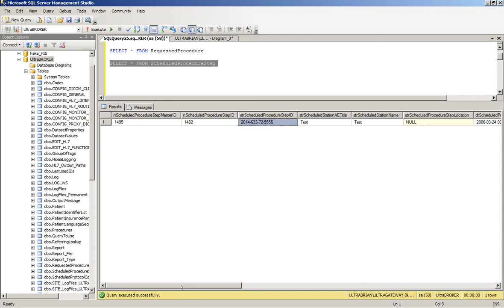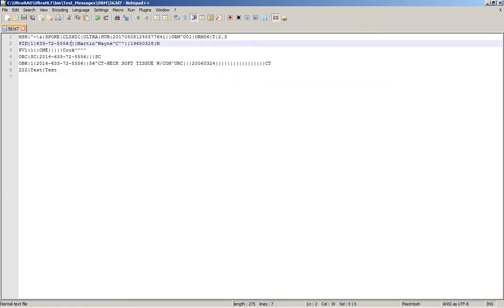Now I want to show you one other feature. For enterprise facilities, in many cases, we have many more than just one patient ID. Let's say you've got a system of hospitals, and each hospital has a different identifier within its own hospital. There's still a master identifier, which is typically in PID 2, but they might have a PID list in PID 3, a list of different patient IDs.